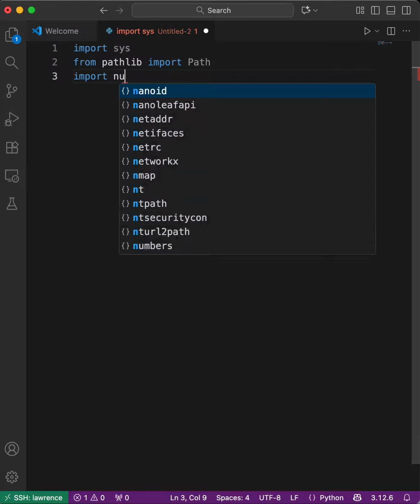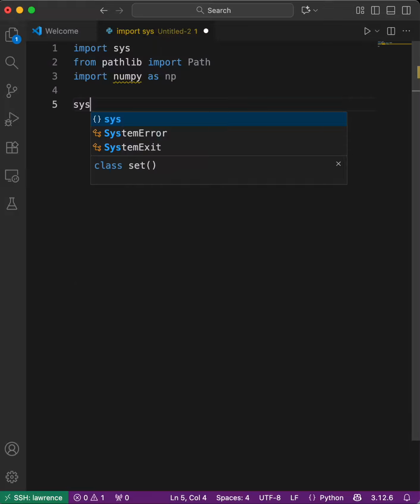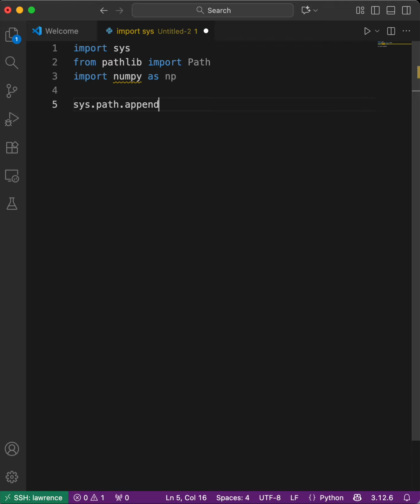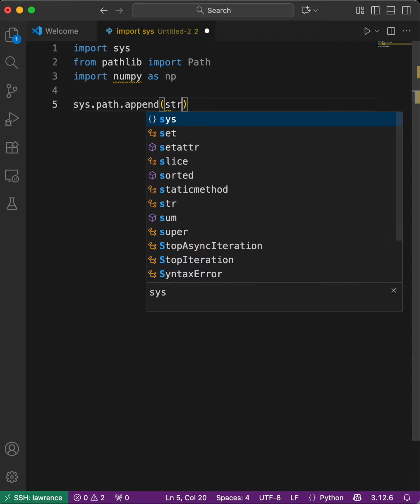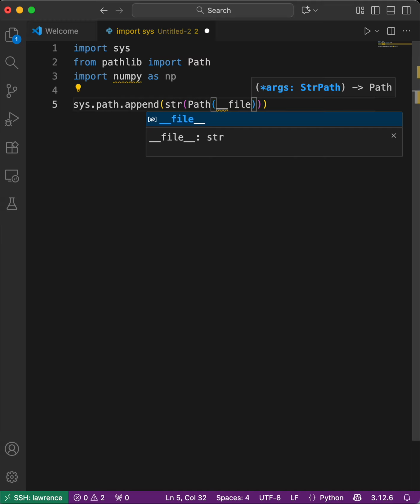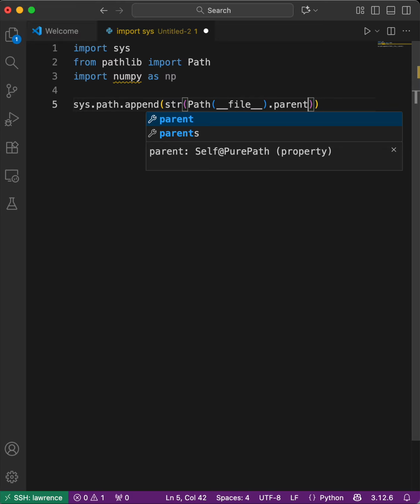And of course, the most important module. And this part here I'll use later on to get the beam parameters, which I can easily manipulate, not touching the original file. Okay, these are some syntax.